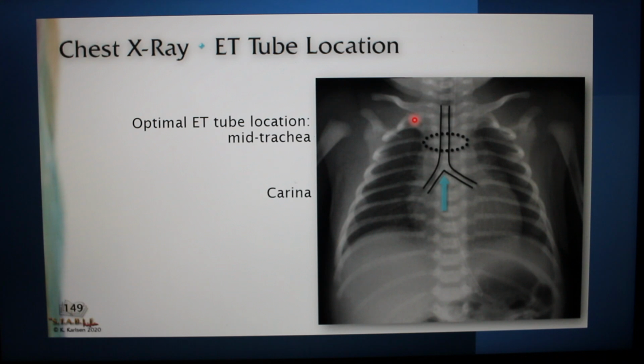We can use those ribs to count, to look at our inflation, to see where the UVC is, to see where the UAC is, and we can tell each other where those objects are based on where they're found by their rib count. So here's vertebral body 1, or T1. It's right here. Here's 2, 3, 4, 5, 6, 7, 8, 9, 10, 11, 12. 12 ribs, 12 vertebral bodies.